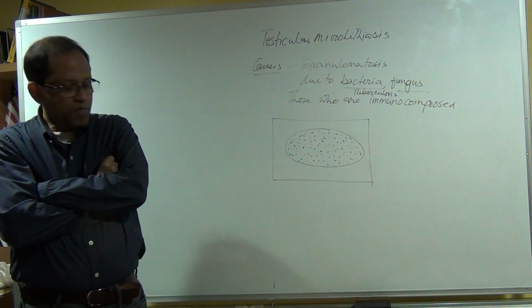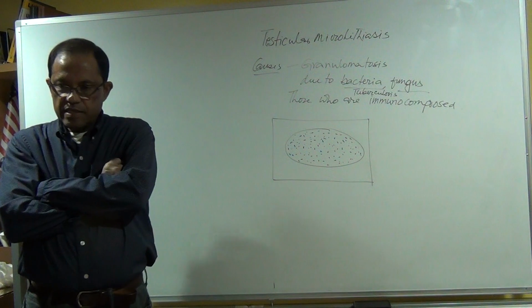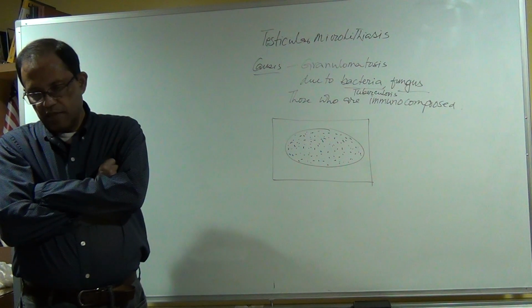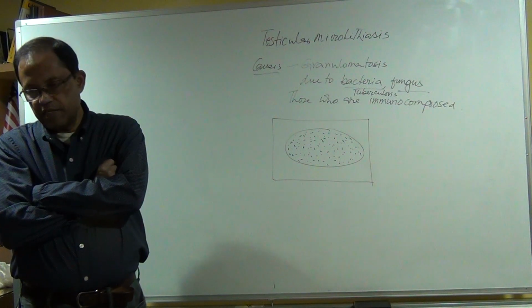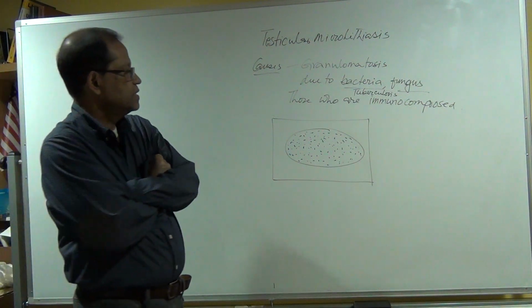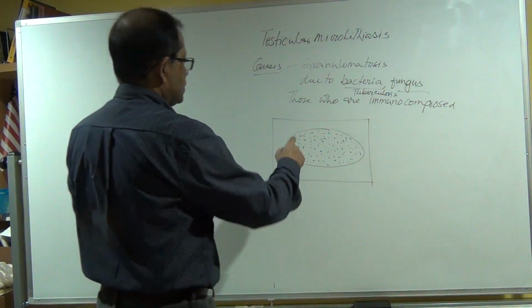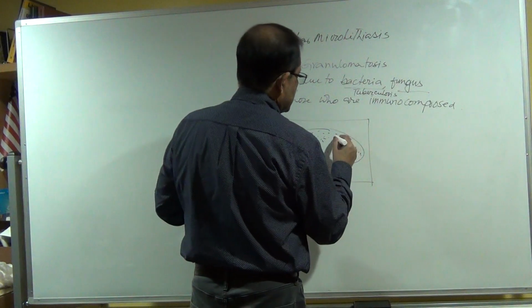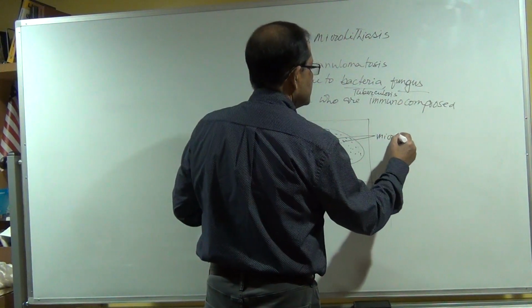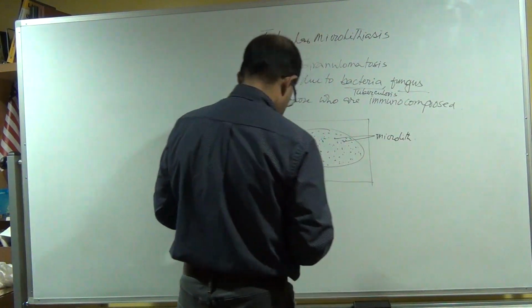That is microlithiasis. This microlithiasis causes infertility. Okay, so this is microlithiasis, this blue one. Microlith.